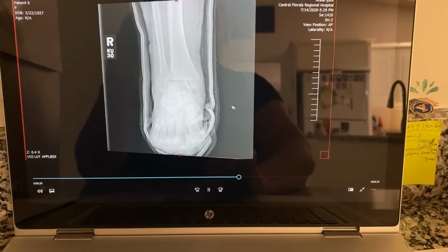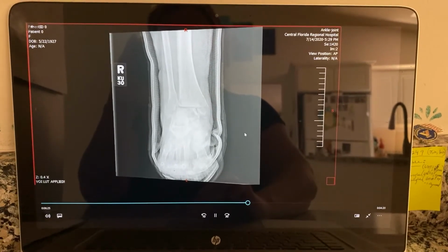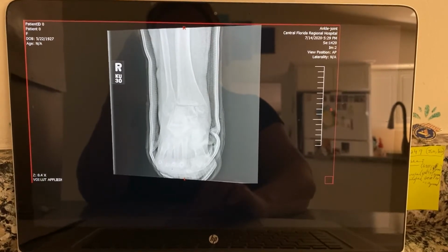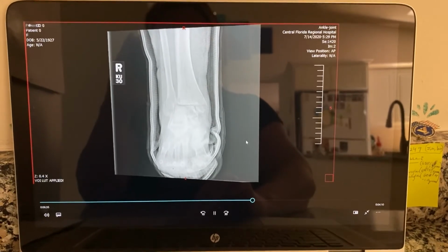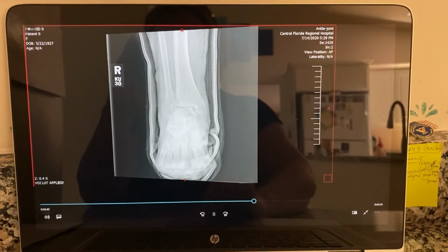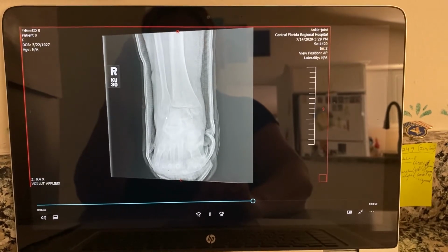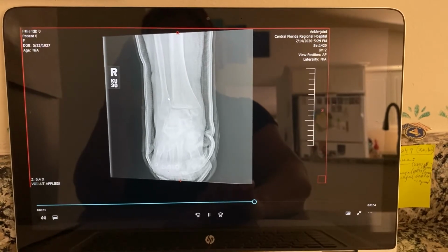Radiation safety achieved by use of AEC to determine exposure at satisfactory penetration levels. Collimation evident, students and techs were positioned behind lead barrier wall. Anatomy demonstrated here is the tibial plafond, the medial malleolus with fracture, the lateral malleolus with fracture, the ankle mortise joint, and the distal tibiofibular joint.